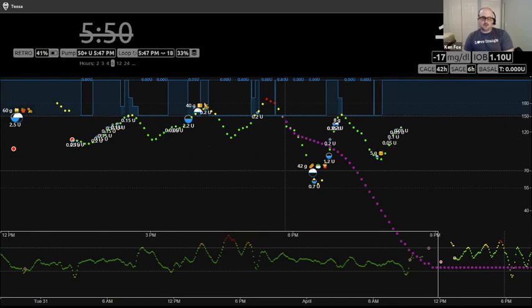You can scroll back and you see this dotted line going vertically that shows you where you are in time, but also you'll see this section over here says retro, meaning you're going backwards. And you'll see a line through it, just to let you know that it's not the active one you're looking at. Same with the blood sugar on this side. It tells you what time you're looking at relative to your current time zone. I'm looking at someone who's on the East Coast, by the way, so it shows me my time, which is 3 hours back from their time. But you can scroll backwards and look at history.